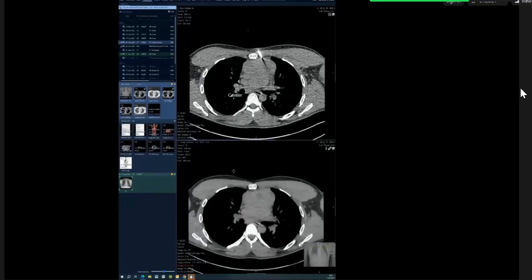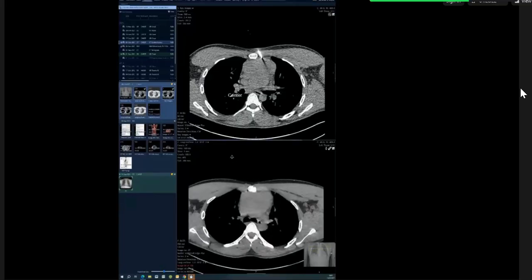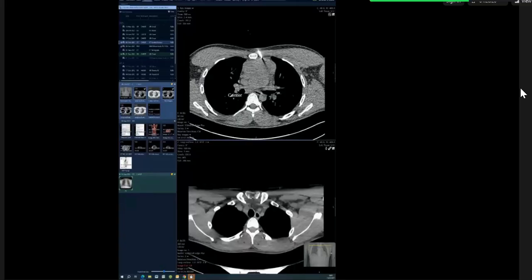I see some low attenuation within it, suggestive of a degree of necrosis. I am following it upwards. It does not seem to communicate with the thyroid, things like that narrow down your differential a bit more. So after the CT, you would say it doesn't communicate with the thyroid, so I am excluding thyroid and leaving me with lymphoma and thymic, etc. as the more plausible differential diagnosis. Again, the report needs highlighting to the referrer on the X-ray. You need to do CT, you need to highlight to the MDT and for consideration of biopsy.